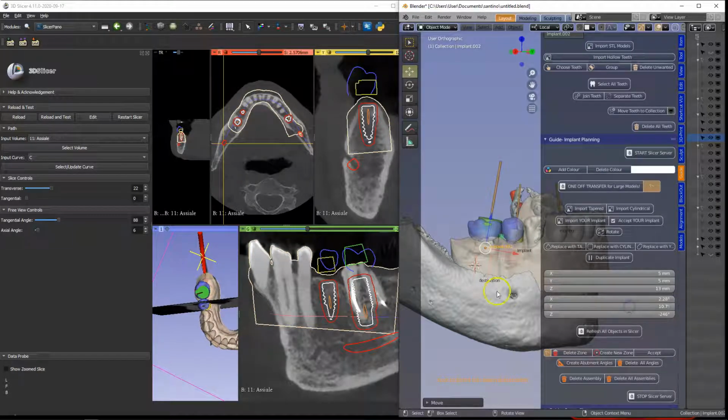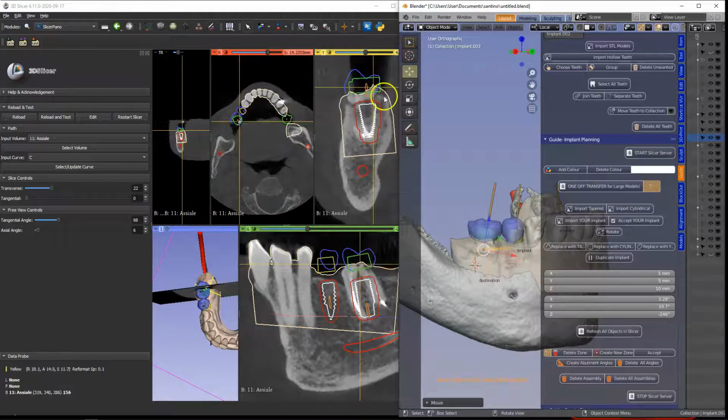Okay, if you feel that's too long, maybe we do go for a shorter one. Maybe perhaps move it across a little bit like that. So again, I'm looking at the molar over here, where the molar is and how it actually extrudes out of the molar.